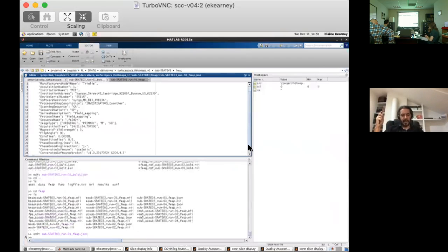And then in SPM convention, it's just a plus or minus 1, because SPM always assumes that the second direction is the phase encoding direction. So the relationship between the DICOM parameters and the SPM parameters is what we are trying to look for, to gain a little more confidence that this J minus information that we have for these subjects actually corresponds to the positive blip directionality in SPM convention.